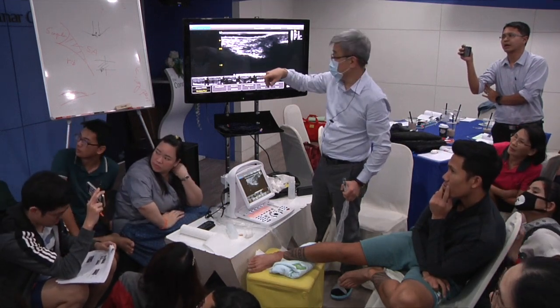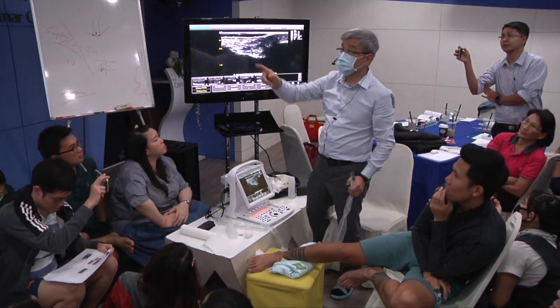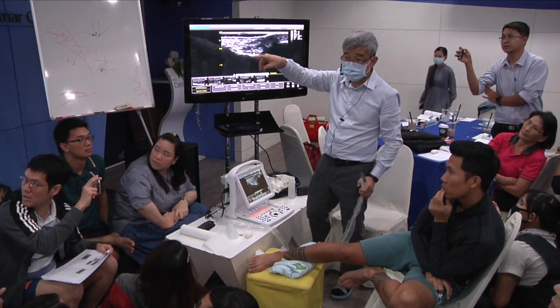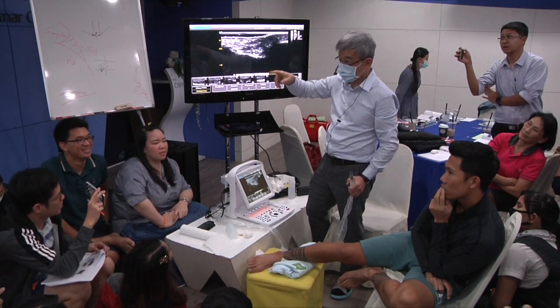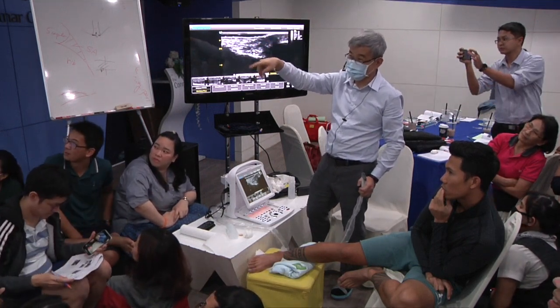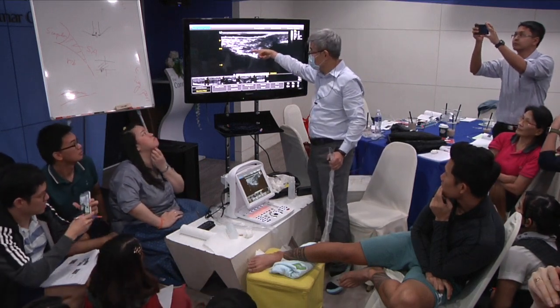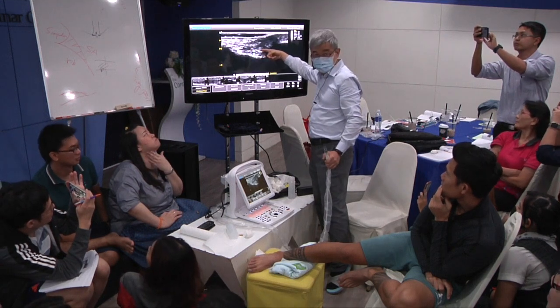This one, but I don't think so, because this is the first generation. Yeah, this is the picture of the first generation. In the new generation, this one is very bright. Don't worry, you won't miss it.